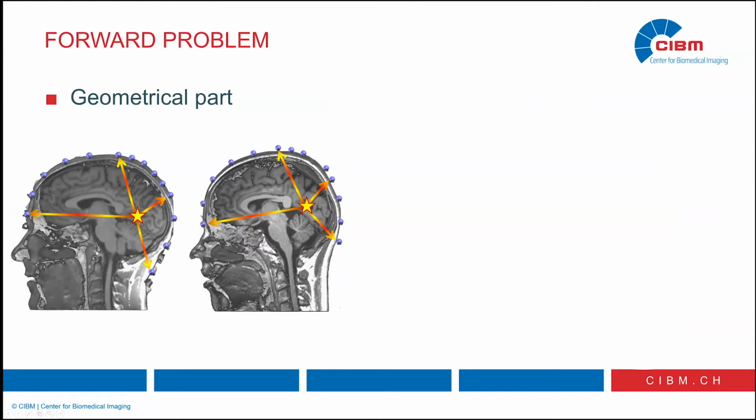On the left, a male, on the right, a female. Doesn't really matter, but what you will see is that you can see already that the shape of the skull, the shape of the brain is totally different, which means that the relationship between every dipole within the brain and the electrodes is really different. The star, for example, is basically in the visual cortex here, and you can see that it will spread much differently on the electrodes according to the geometry on the left and the right.